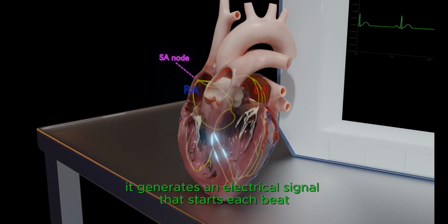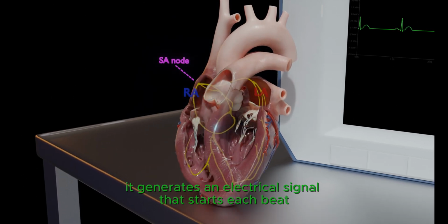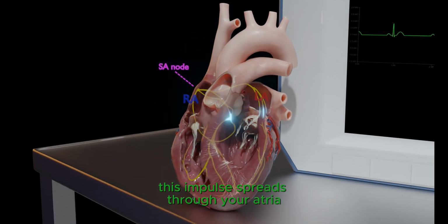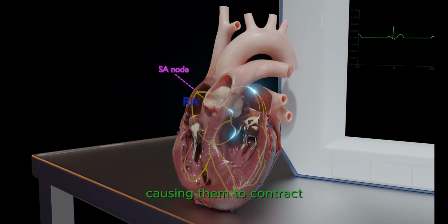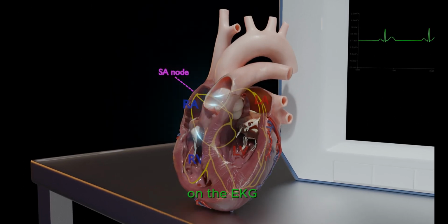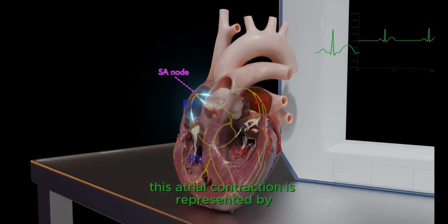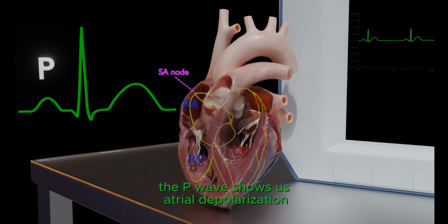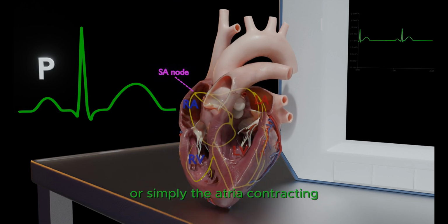It generates an electrical signal that starts each beat, typically 60 to 100 times per minute. This impulse spreads through your atria, causing them to contract and pump blood into the ventricles. On the EKG, this atrial contraction is represented by the very first bump, the P wave. The P wave shows us atrial depolarization, or simply the atria contracting.